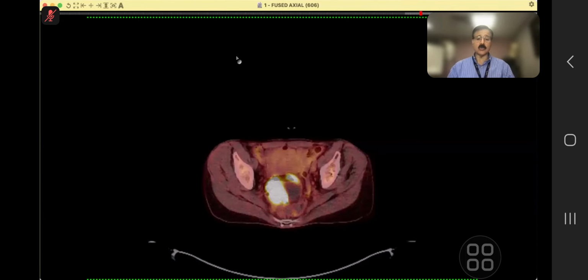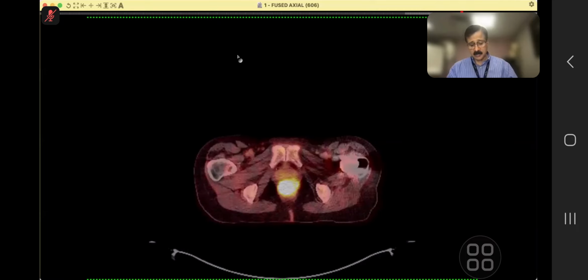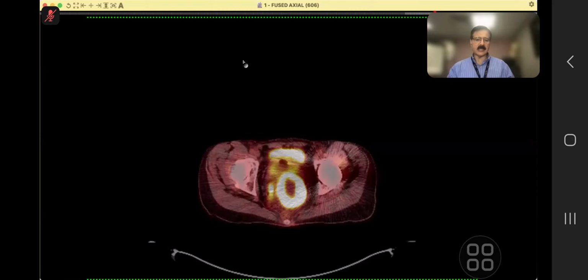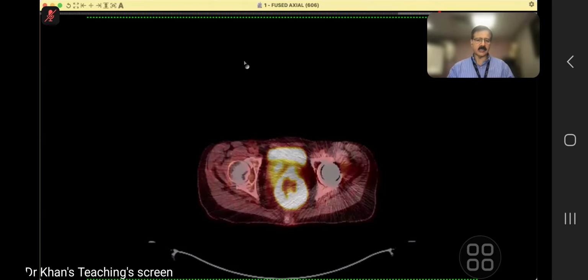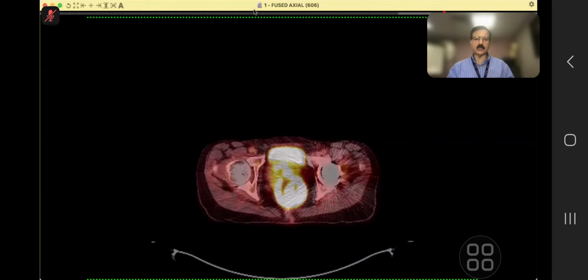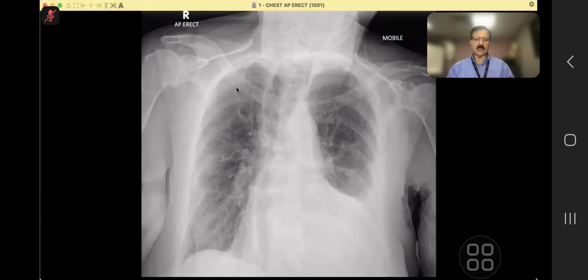Mucinous carcinomas have come in the exam, and the concept is that mucinous tumors will have high signal, as in white signal, and prognosis wise, they are bad. It is taken as a worse off sign. There was a PET scan, which is irrelevant for you, but I think it was just downloaded, so we will skip it. Over to you, candidate.